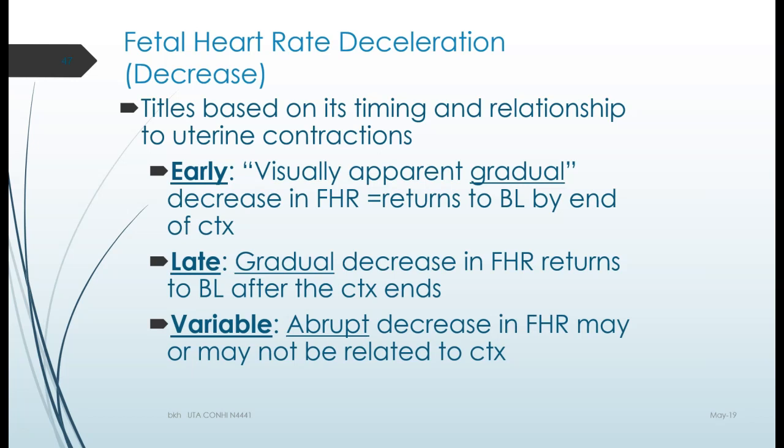An early decel is a visually apparent gradual, see that gradual underlined right there? You can see it. It's a gradual decrease in the fetal heart rate, and it returns to baseline by the end of the contraction. When you look at these, it starts to decrease about the time the contraction starts.